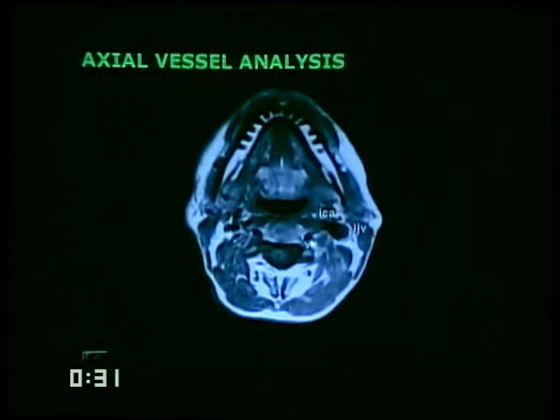One of the important things to remember is the jugular flow void. While it is called a flow void, there is notorious asymmetry between the jugular flows on either side, and oftentimes the flow patterns may be so turbulent as to give you a pseudo-neoplasm or pseudo-thrombus formation.